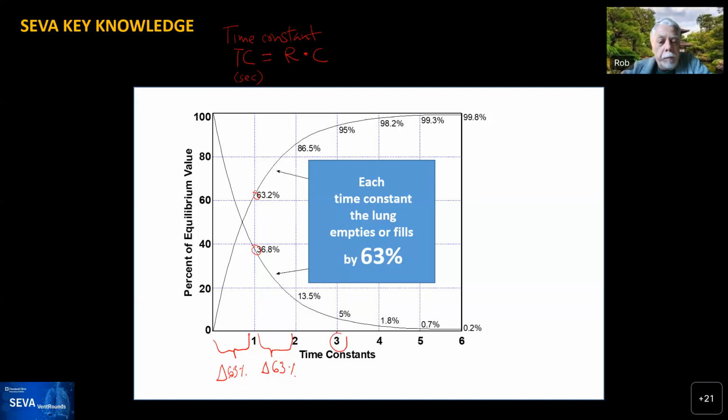And this is key not only for pressure control. Right now we're controlling volume, but we'll see some examples in which we were controlling pressure. You would see it during inspiration, and as Rob said, regardless of the mode, we would always see it during expiration.